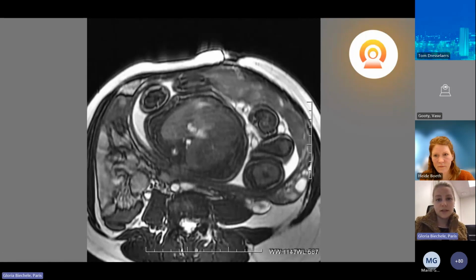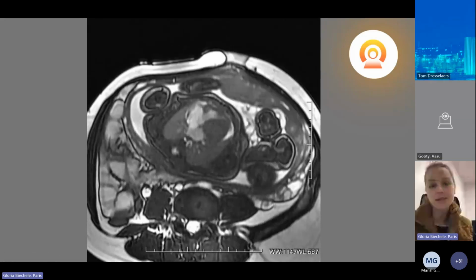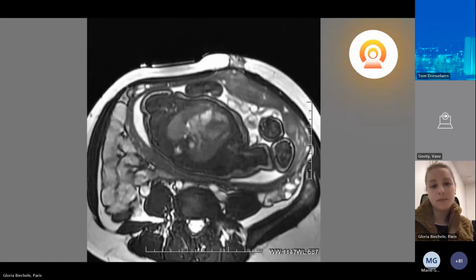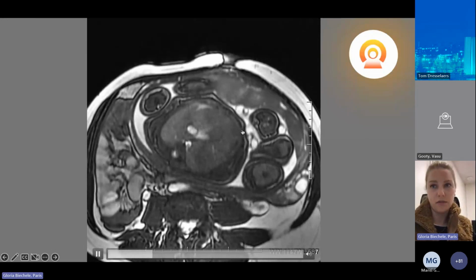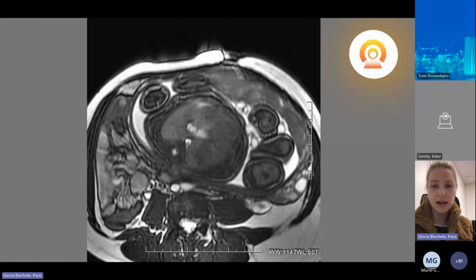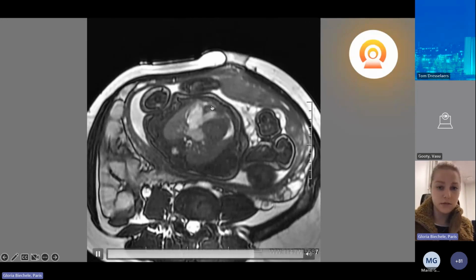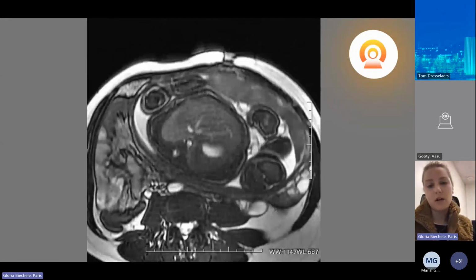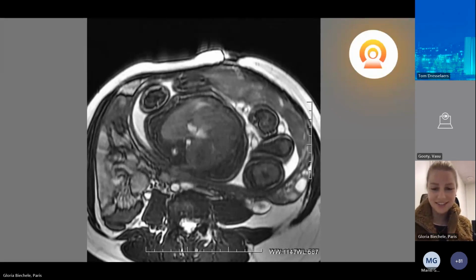In which you can see quite some double contours of the abdominal walls, which is caused by movement artifacts of the mother. And apart from that, we noticed a generalized hypokinesia of the left ventricle compared to the right side. This part is not really contracting, whereas the right side shows good contractions. What I think also caused some of our signal problems, but we can discuss this later.